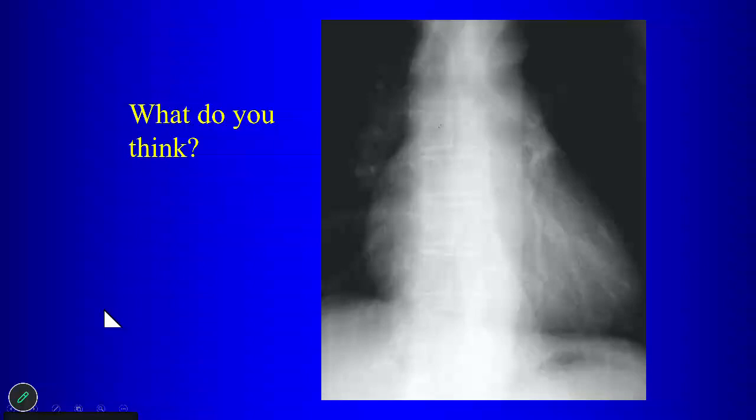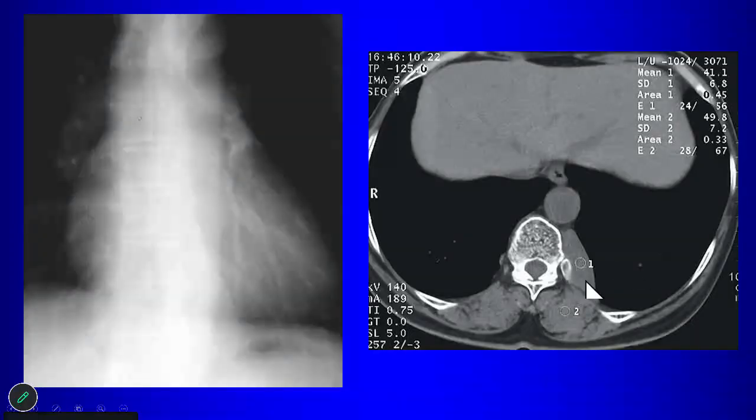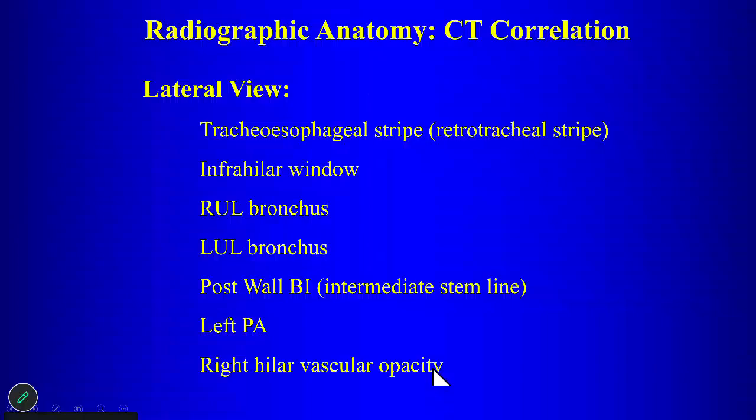Okay, so what line is deviated? By the way, when you take the core exam, I understand there's a lot of radiographs on that exam, and they ask you to put the arrow on the abnormality. I suspect a lot of those abnormalities might involve deviated mediastinal lines. So what lines deviate? Yeah, so the left paravertebral line, what compartment is that? Posterior mediastinum, first thing on your differential. Neurogenic tumor, right? So that's a neurofibroma here causing deviation of the left paravertebral line.